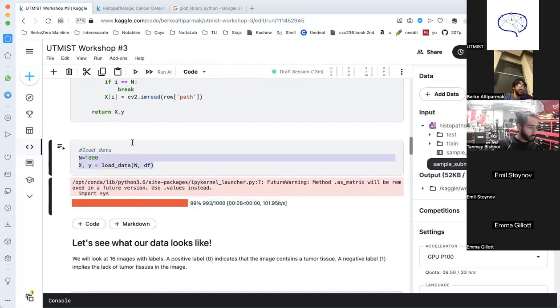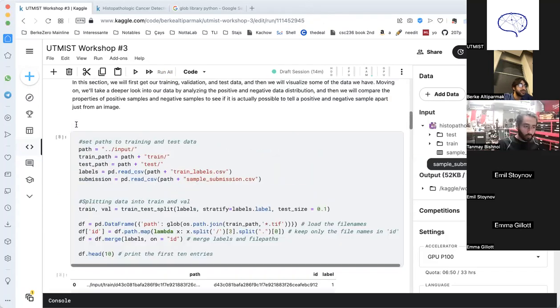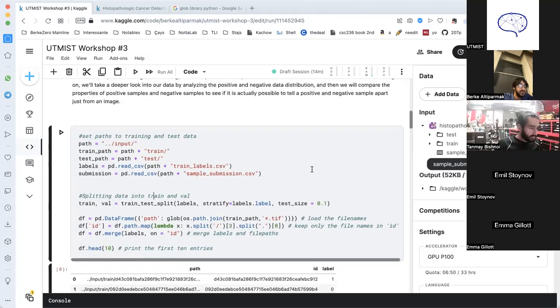So this is a line of code that we wrote. Did everyone manage to write that? Can I see in the chat? Did it work? Yeah. Can you scroll to the train test split for a second? Yes, let me do that. Let me do this as well.